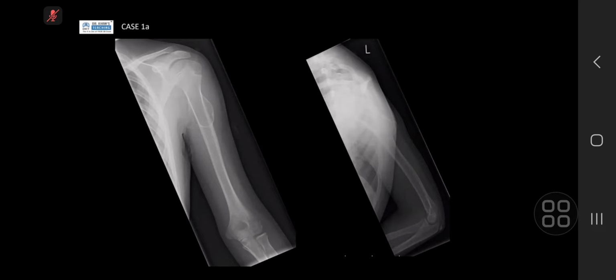If the patient has pain, I suggest there is a malignant change of osteochondroma. I will review if this patient has had an MRI before to see the cartilage cap thickness. If this is more than 1.5 centimeters, I will go with chondrosarcoma transformation of osteochondroma. I would also rule out soft tissue change, as this would advance the patient from benign osteochondroma to chondrosarcoma.